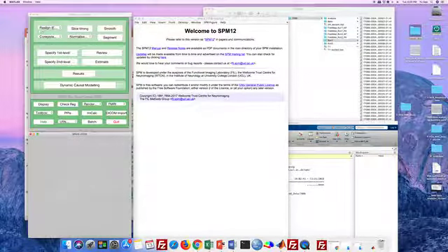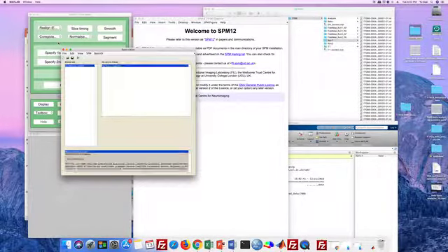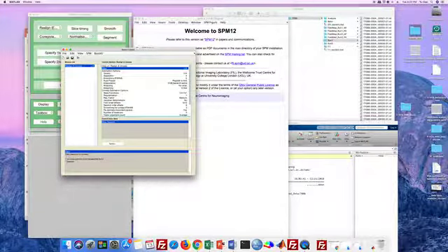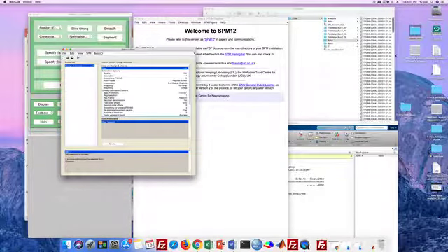Okay, so click this button, Realignment. Choose the last one, Realign and Unwarp. So the batch editor appears. Before you do realignment, make sure you didn't do it before. This is the clean data. You just dump the reorientation. Otherwise, your image will be reoriented twice, which may not be accurate.